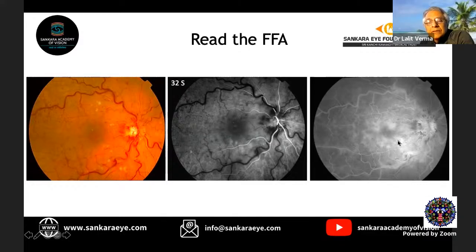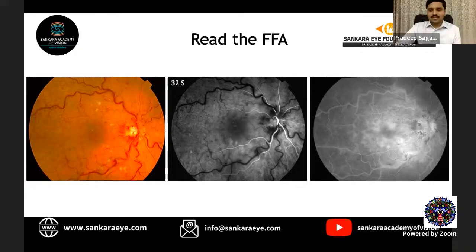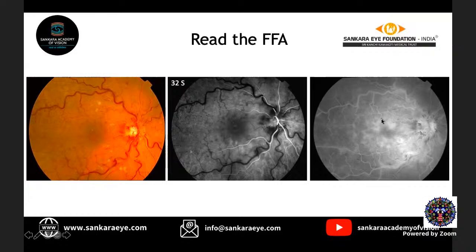The late frame. There is pooling of... Not pooling. So what can you describe? What has happened over here? What do you see? What is this actually? What are these? Sir, microaneurysms.